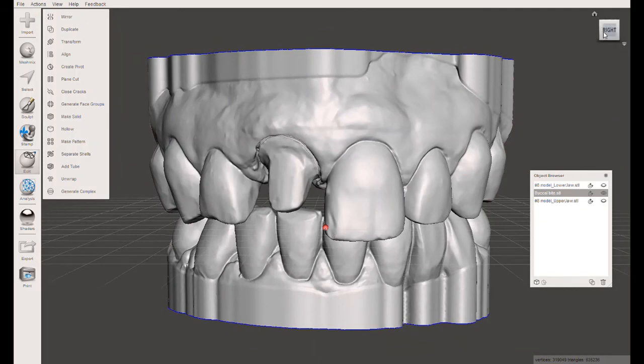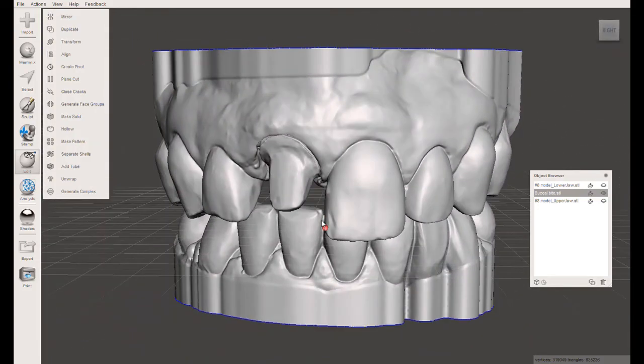Hopefully it's a pretty easy tutorial, and in order to be able to do this, like I said, you're going to have the software version 5.2.3 for your chair side. You'll have to have your InLab 22.1 software installed, along with your model and your splint modules on your PrimeScan. And then your IT department will also have two separate JSON files or JavaScript files that they're going to have to put into the hidden folders for program data, which I will send them a tutorial on how to do. And you will have this ability to be able to send a ditched STL model off to the Army Dental Lab in no time at all.